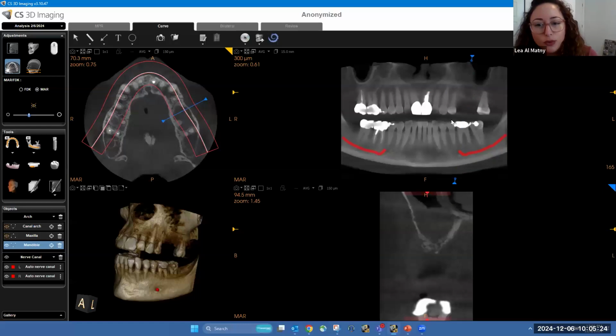So especially if you are placing implants, you took the scan to place implants, it's good for the patient to know, okay, I also have these I need to take care of. Are we going to extract number 9? Do you have any symptoms on number 9? Will we place all 3 implants at the same time? Or do you want to take it step by step and see 6 months from now how you feel about it?